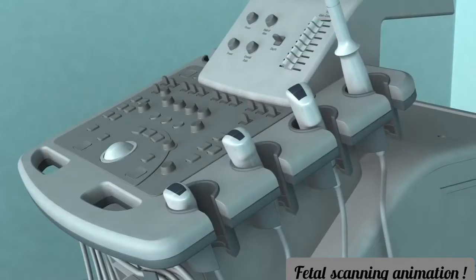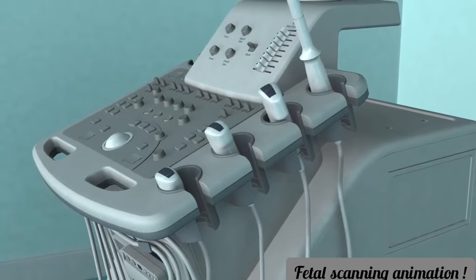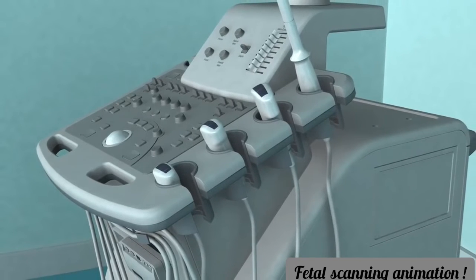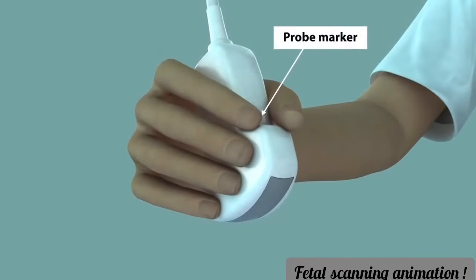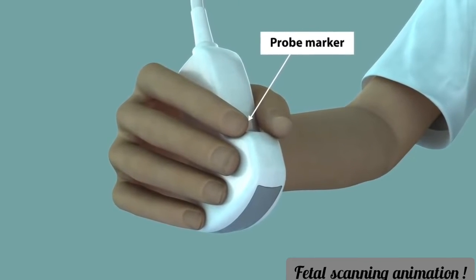Select the probe and preset which are most suitable for the gestational age and body mass index, or BMI, of the woman. Hold the probe with your right hand and operate the machine controls with your left.